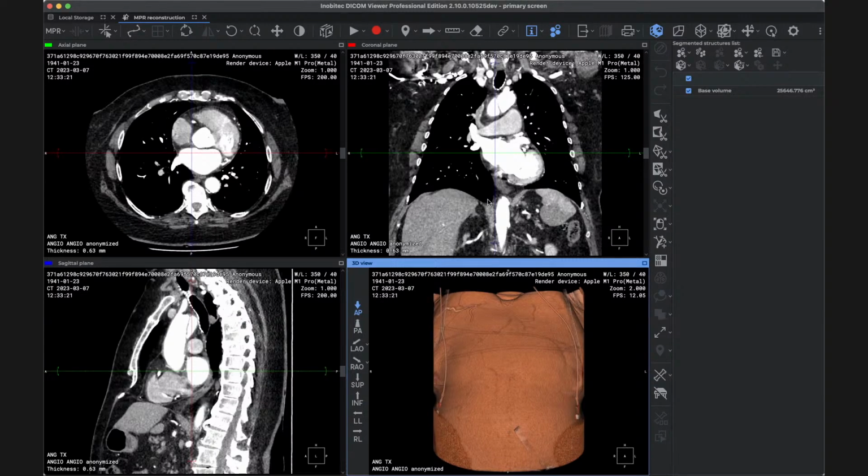I realized it using the automatic vessel segmentation that we're going to talk about in the next case. Without the color table for the skin and with the color table for the skin, the final result is completely different. So I think it's important to say that this color table helps to reduce the noise, and I think the algorithm, especially the automatic vessel segmentation, can see the pixels better than when we don't use this color table.